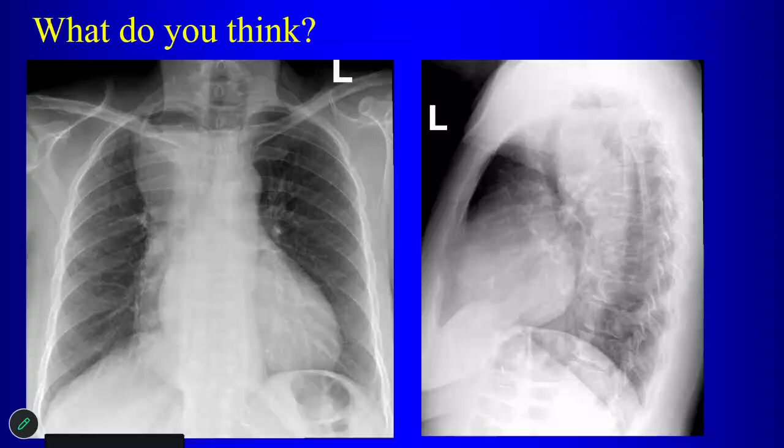Could be achalasia. So what's the finding that really gives it away? Air fluid level. Yeah, there's a nice air fluid level here. Okay, and you can see that on the lateral view too.